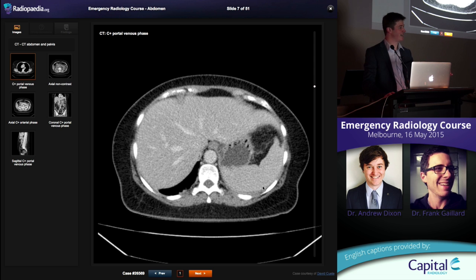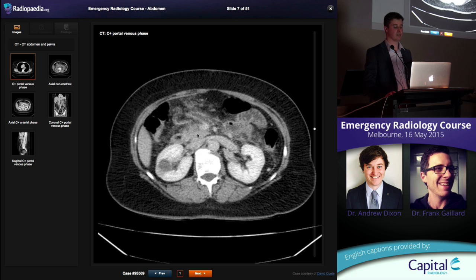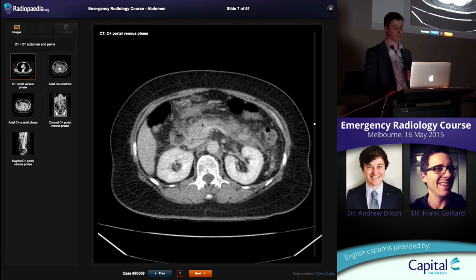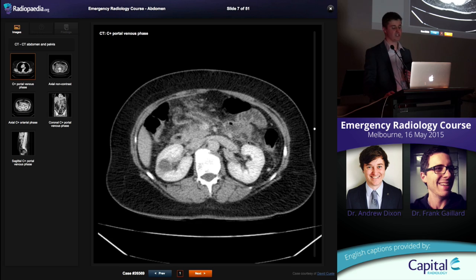And because fat is dark and edema is a little bit more towards fluid density, it's going to create this increased density in the fat around it, a little bit of what we call fat stranding, inflammatory stranding. Okay? So this pancreas, this is a bulky looking pancreas, okay? Slightly lower density than most pancreases that we see, particularly this area in the head here. And look at all the stranding of the fat next to it. Ill-defined margins, all this stranding.